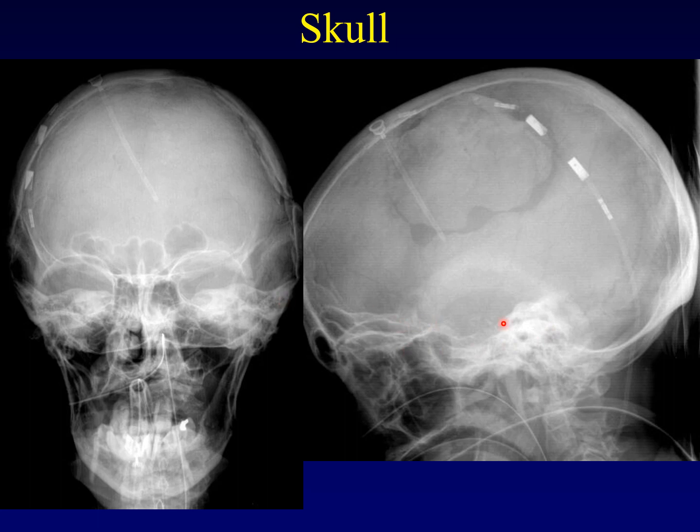You can see how dense the skull is, except for this little line here where a neurosurgeon has drilled into the skull, taken off a piece of skull to perform surgery, and then put it back in place. Other interesting things that you can see here include a radiodense tube that has been inserted into the center of the brain that is draining CSF because this patient is incapable of draining CSF in the usual fashion. These are called ventricular shunts. This particular ventricular shunt has been shunted down towards the abdomen.